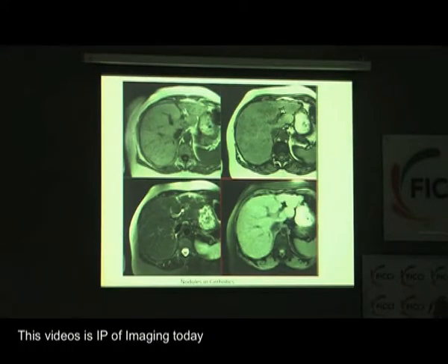Moving on to cirrhotic livers, cirrhosis does not necessarily always land up being uniform and involve both the lobes to the same degree, and you will have asymmetric cirrhosis. So here's a patient who has asymmetric cirrhosis with nodules in the left lobe. This can be mistaken for tumoral nodules, especially when the right lobe looks normal.